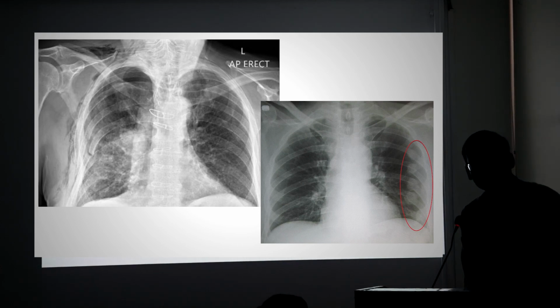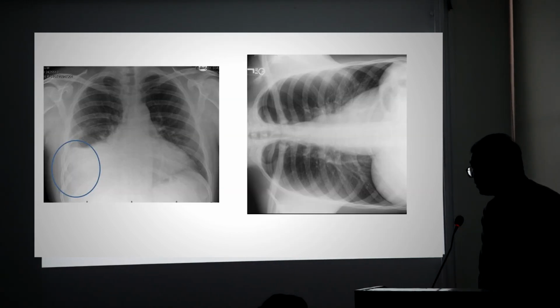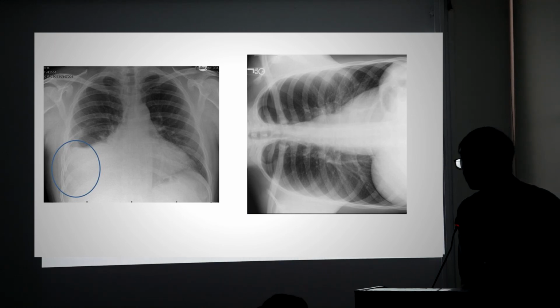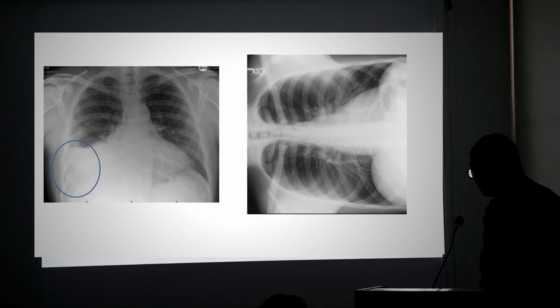Trauma case came to the emergency. Portable X-ray done. Rib fracture. So when it heals, it forms a lot of callus. In such a trauma patient, what do we have to see? If there is an effusion with rib fracture, what do we have to think of? Hemothorax. Fine. Because if there is a hemothorax, we have to drain it.